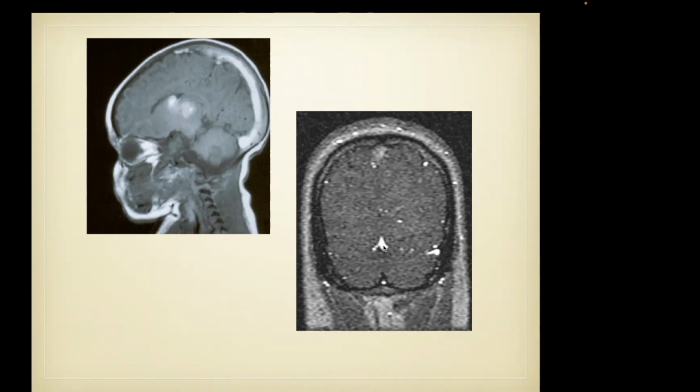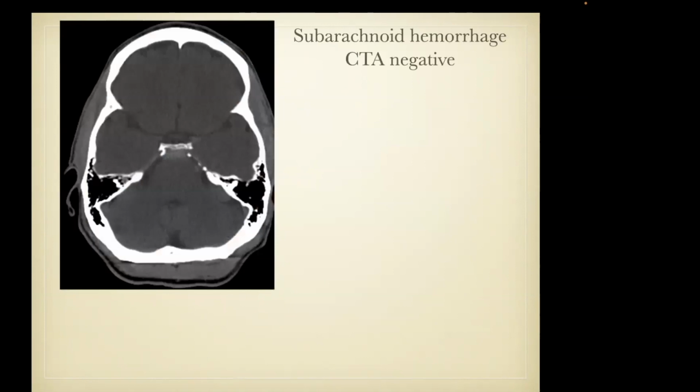So this is the way normal flow looks here in the one transverse sinus and a little bit here in the torcula. But even though there's thrombus in the superior sagittal sinus, we get signal not from flow-related enhancement, but from the T1 shortening from the thrombus. So again, this is a pitfall of MR venography. You can also see the same property in subarachnoid blood, in 3D time of flight.